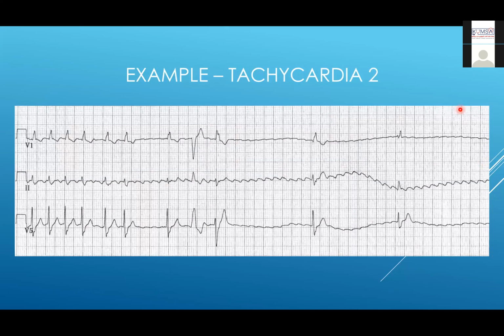Who wants to interpret this ECG? Okay. This is a timeline of a patient. This patient came in with palpitations.